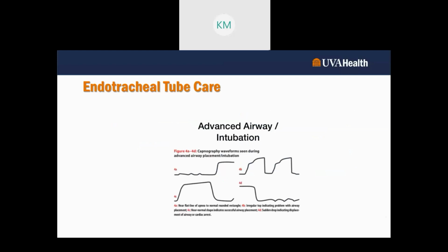Moving on to 4B, what you're looking at is a biphasic waveform. So it kind of looks like the top of a cliff, if you will. That biphasic waveform indicates a problem with our airway placement. Specifically, the patient is probably right main stemmed. So I do get numbers because I am, in fact, in the lungs. However, it's kind of a cliffy waveform there because I'm not getting the full exhale out, not all the CO2 out, really that consistent number, if you will.